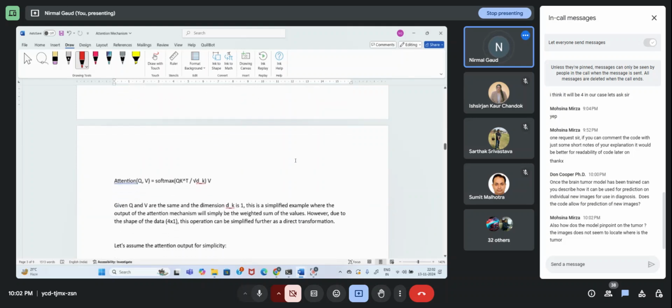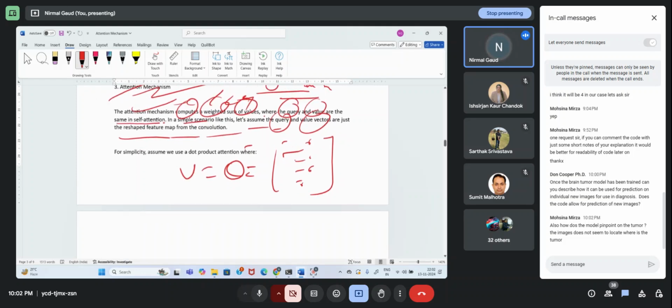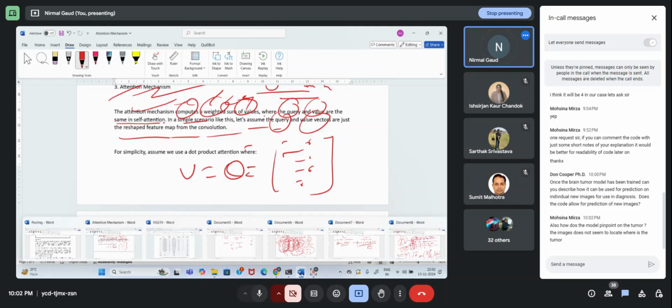That means they are just all minus 6, minus 6, minus 6, and minus 6. That's what they are. This is query and this is the value only. Query and the value. Okay, there was a key. I just showed you a key.